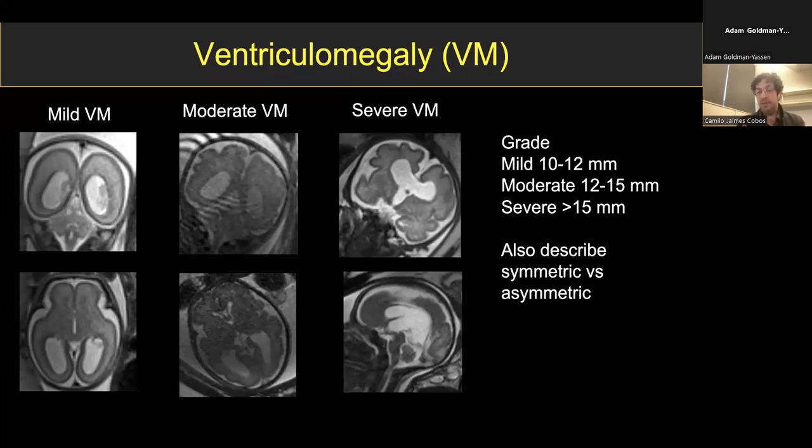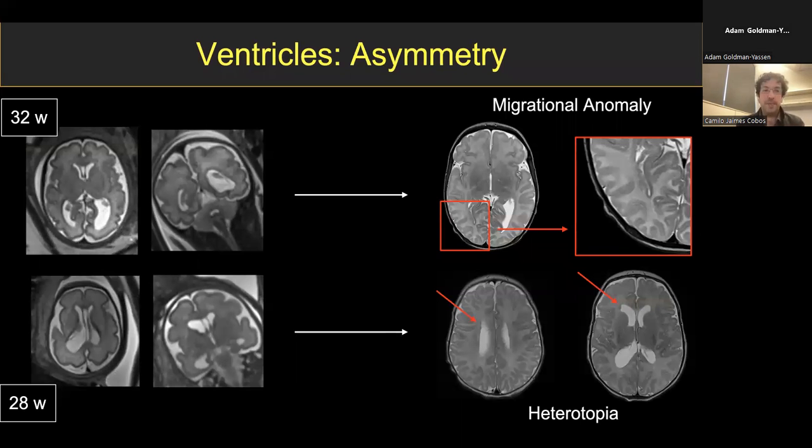But in reality, if you have no evidence against it, septo-optic dysplasia is a perfectly reasonable thought, but just realize that because you don't see the septum pellucidum does not necessarily mean that it was not there. It can be the result of a destructive injury arising from abnormal CSF dynamics.